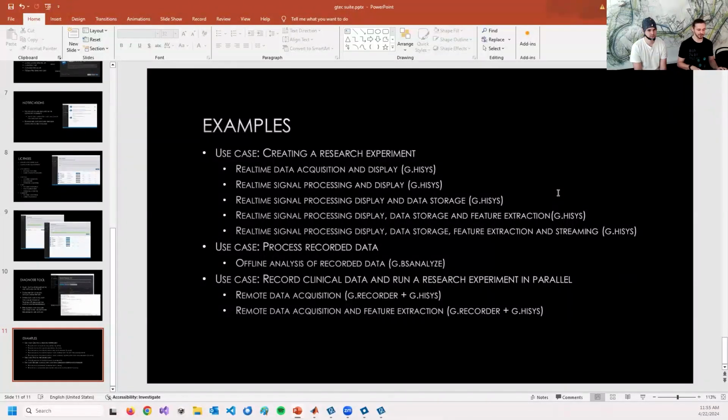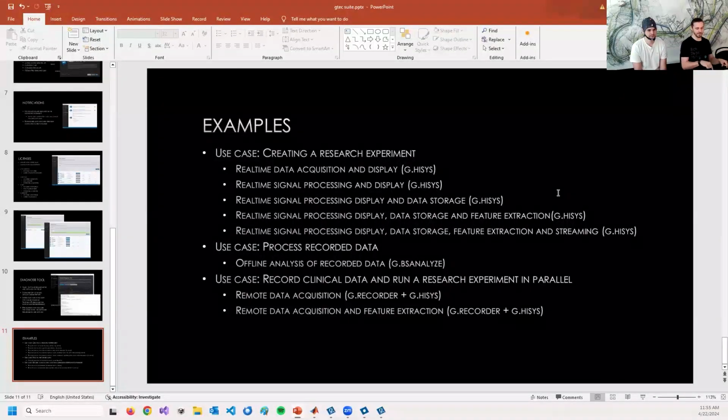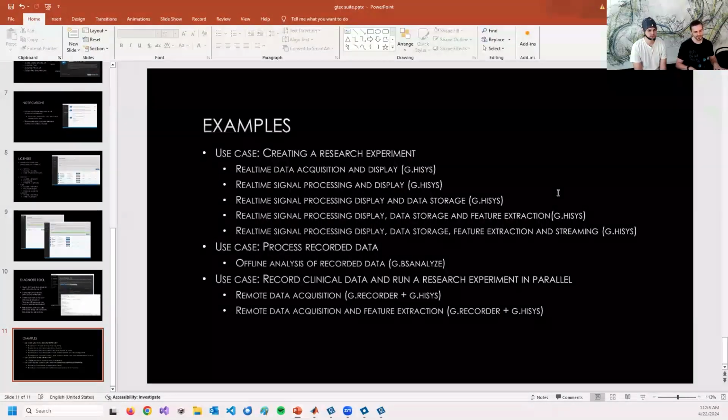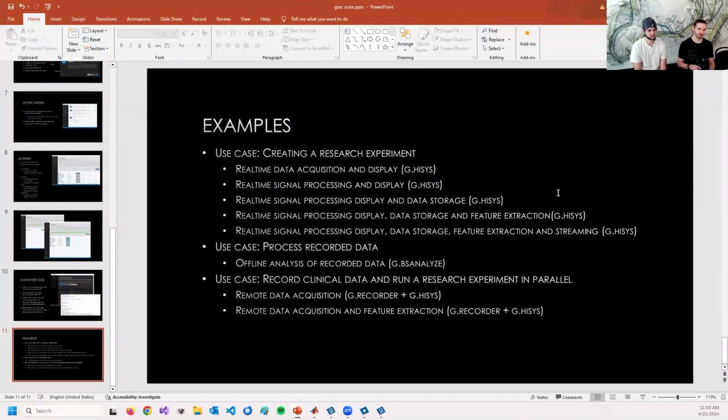But in the worst case, you can always stream on many PCs in parallel, like on 5 PCs. You connect one Unicorn to each PC and then take Lab Streaming Layer and merge all the data streams. So that would be one solution for multiple PCs. And on one PC, I wouldn't do more than two devices because Bluetooth is breaking at some point.